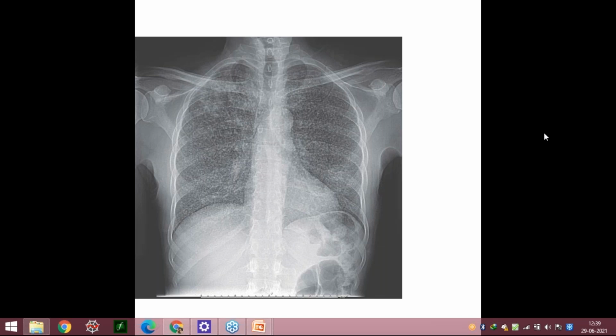So if the patient is presenting to you with a normal oxygen saturation, it is likely to be miliary tuberculosis, with the obvious definite history of constitutional symptoms like loss of appetite, weight, and fever. However, if the patient is presenting with shortness of breath, difficulty breathing, and this X-ray, and the saturation is dipping down to 80, 70%, you always consider diffuse alveolar hemorrhage.